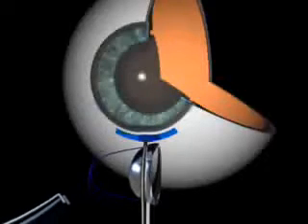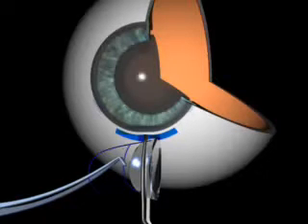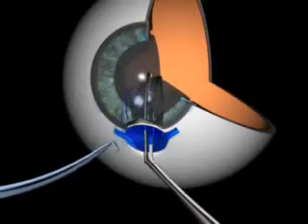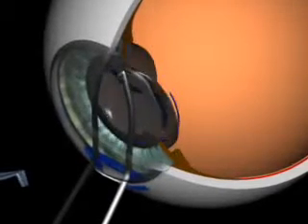IOL implantation. The folded IOL is inserted through the incision. The haptics of the IOL are positioned in the capsule bag, and the lens is slowly unfolded. The optic of the IOL is also pushed into the bag.